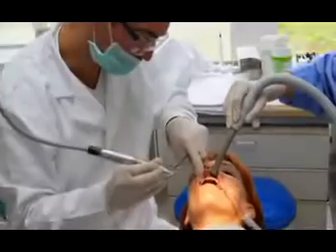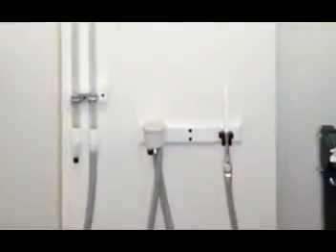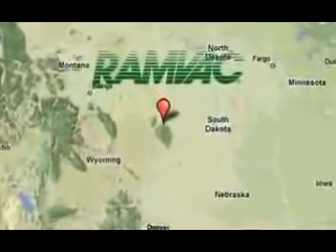Questions often arise about the fluid and particle dynamics within a dental vacuum system. There is an assumption that the movement of liquids and solids mirrors that of standard plumbing. But there are some significant differences. So to show what really happens inside these vacuum pipes, we visited Ramvac in Spearfish, South Dakota.